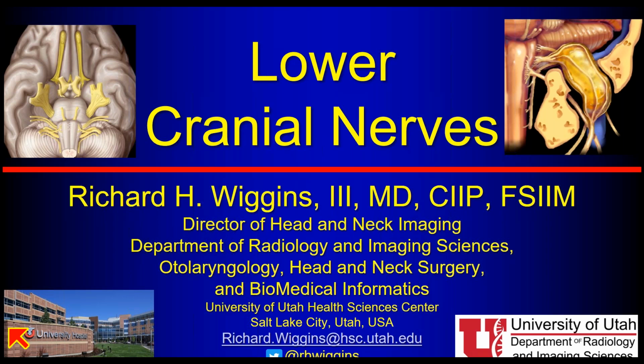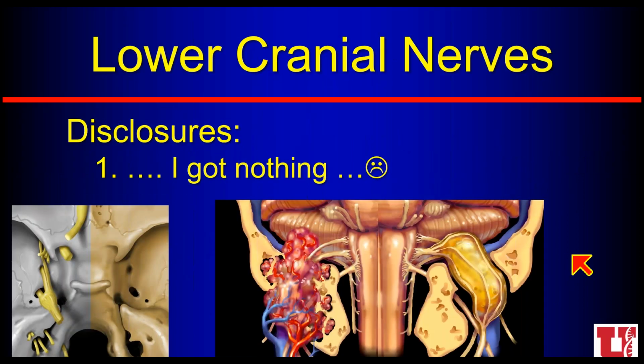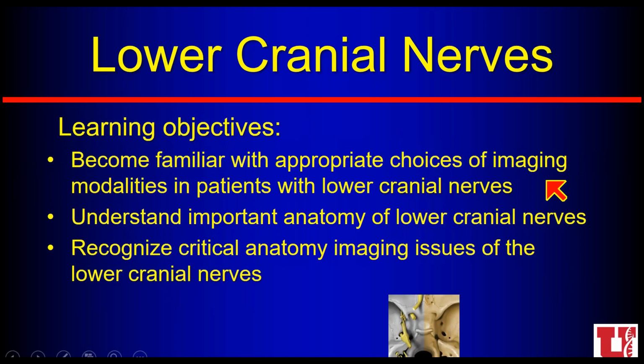Okay, thank you, sir. Hello, everyone. Today we're going to talk about the lower cranial nerves. And I have nothing significant to disclose. So we're going to talk about how we image these, and for each of these cranial nerves, we'll look at their anatomy and talk about their anatomy on graphics and look at their anatomy on imaging, and then look at pathology that happens to that anatomy and look at the important anatomy around these areas.